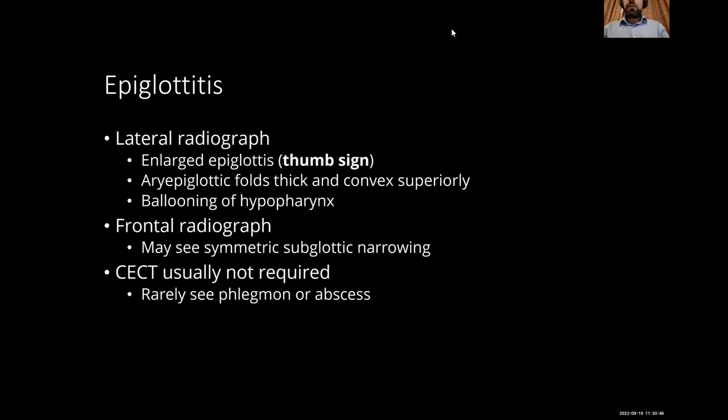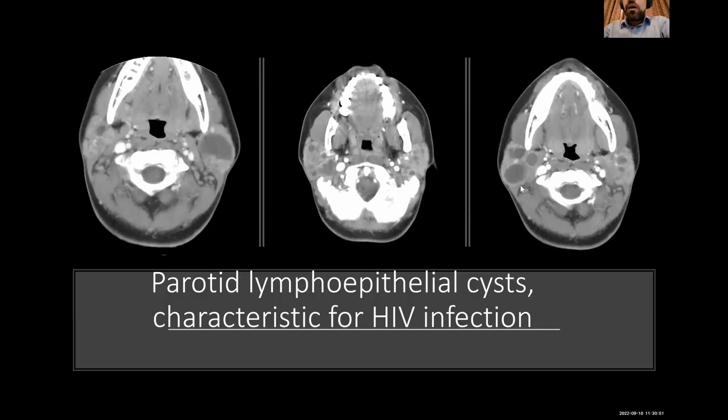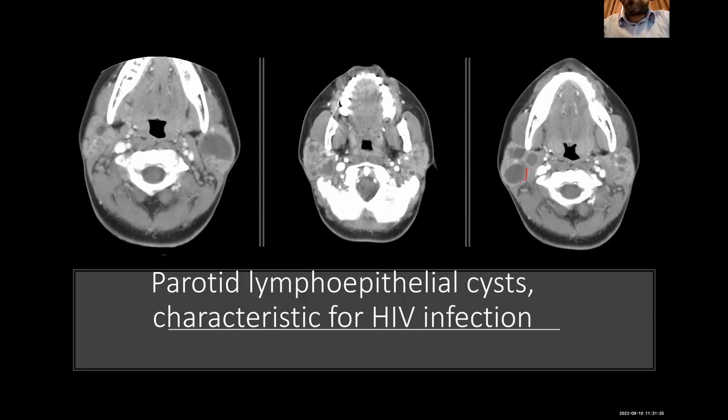Let me turn back to this case. This enhancement is not true enhancement.